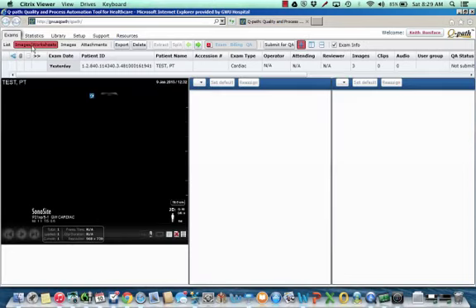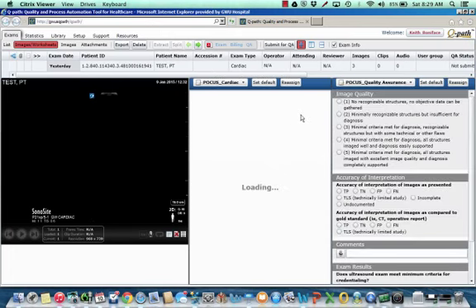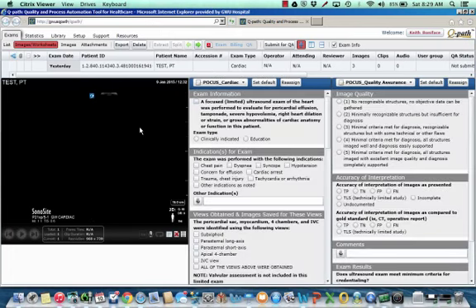And if you go to images and worksheets, it will pull up a QPath worksheet here. Now the screen is divided into thirds here. You have your images here on the left, you have the ultrasound template that you fill out here in the middle, and we have our QA template that we fill out on Monday morning over on the right.